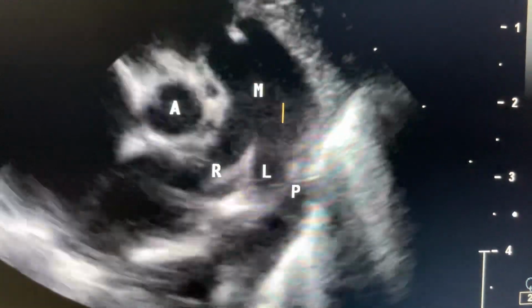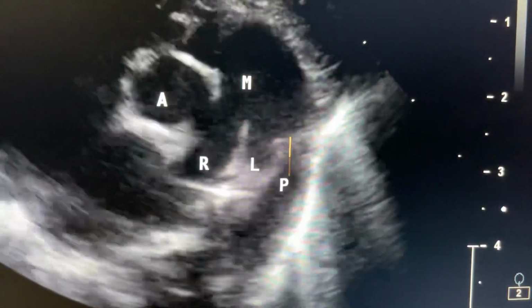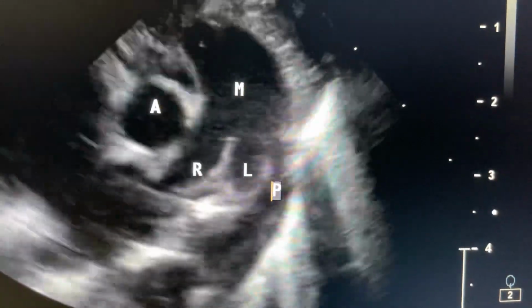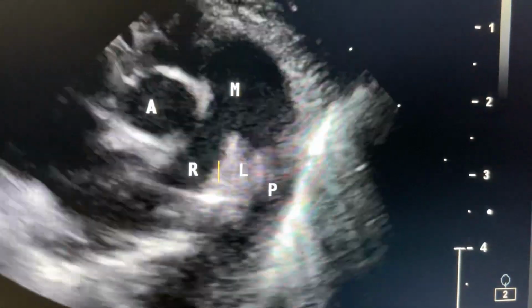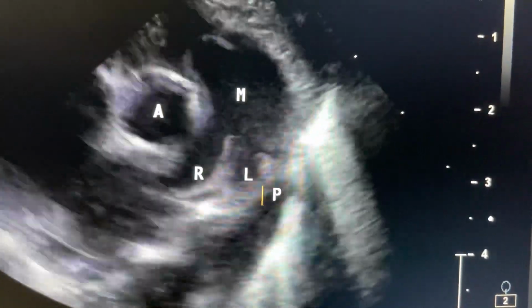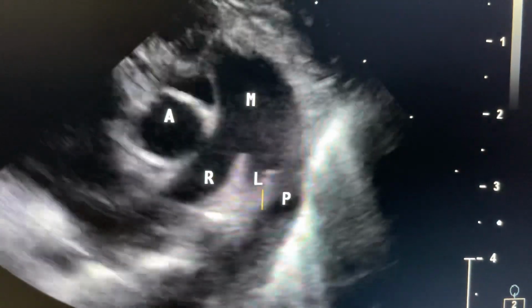This is main pulmonary artery. Main pulmonary artery is giving 3 branches. In that case, the third one from the right side should be patent ductus arteriosus. So the PDA is always the most lateral structure, even left to left pulmonary artery branches. Just remember, left to left pulmonary artery branches is PDA.